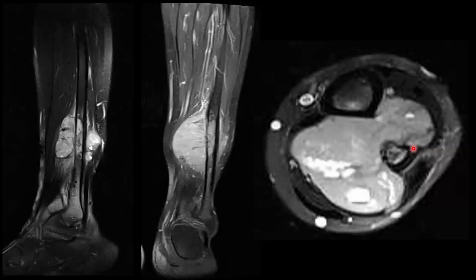If you see the MR images, MR images play a big role in such situations. You can very nicely see the involvement of the medulla of the fibula. There is a huge soft tissue component around the fibula. Some T2 hypointense areas are there. This is a PDFS image. T2 hypointense, some septations are there. See the classical dumbbell-looking mass lesion with a large posterior medial component.